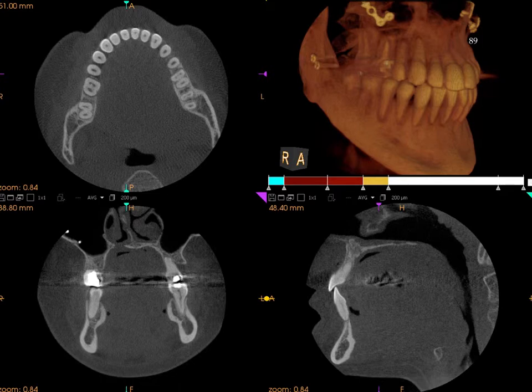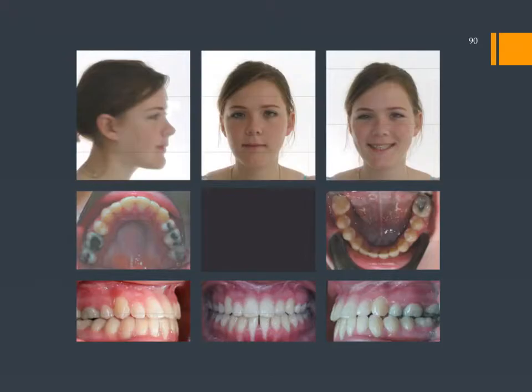It's my opinion that we're kind of ignorant about the limitations of tooth movement in the alveolus, and in the past we moved our teeth without worrying about the cortical bone. We are doing some research which I hope will shed some light on this. So this gal definitely wound up with some problems with those lower incisors.